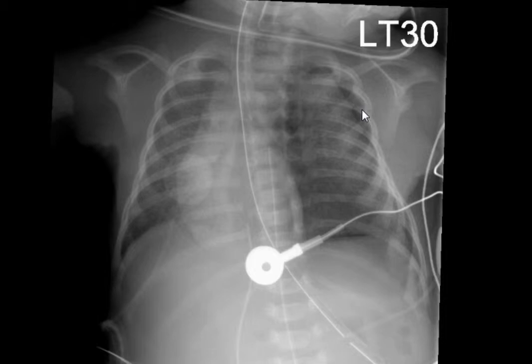But just be aware that in addition to the area you see lateral to the lung, this whole lucent area medially is also an anterior pneumothorax. The fact that you see the posterior recess so lucent means there's a lot of air under the lung as well. So this is a lot bigger pneumothorax than you can really imagine. If you ever really want to know the size of a pneumothorax, you really have to do the contralateral decubitus view.